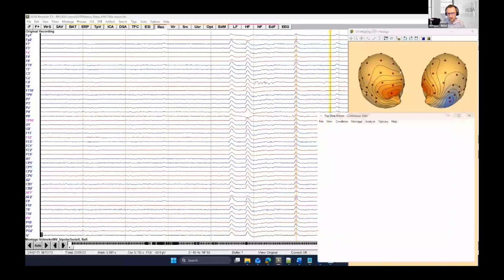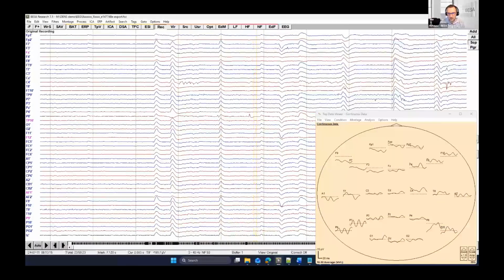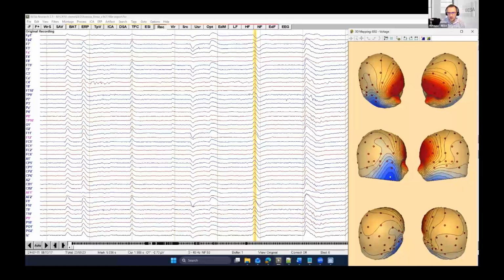Yeah, there's still something fishy happening with this P8. Let me double check here. Yeah. So actually P8 is again the wrong channel. This is very important for you to know that it's worth checking, because later all our results will be spoiled by this. So I will interpolate P8, and now we can close the mapping and restart the mapping to see. Yeah, now it looks fully correct.